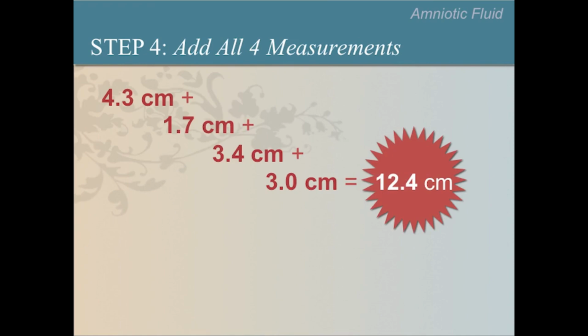Is this AFI normal? Please pause the video now to encourage responses. The answer is that a normal AFI falls between 5 to 24 centimeters. The AFI in this patient is normal.